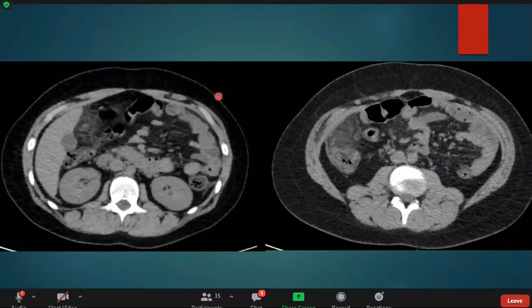So for our patient, what are the usual findings for epiploic appendagitis? First, look for the antimesenteric fat attenuated mass with a hyperdense rim with adjacent fat stranding. There could also be a thickening of the colon wall, which is reactive, and the specific central high attenuation dot sign, which represents the thrombotic vascular structures in the center of epiploic appendages.